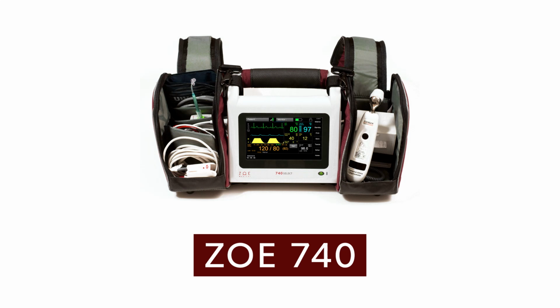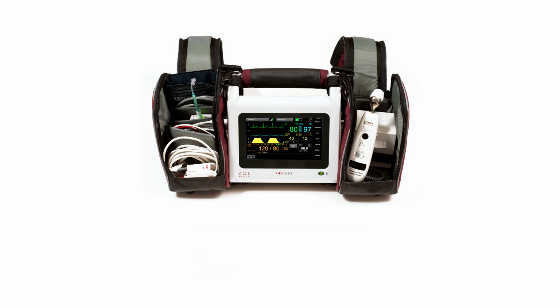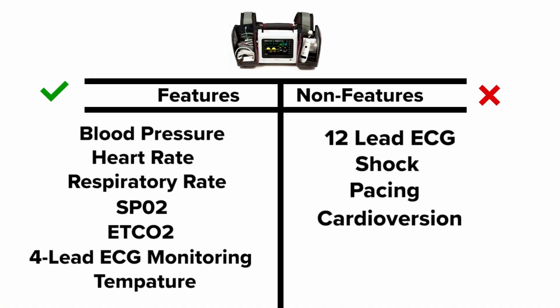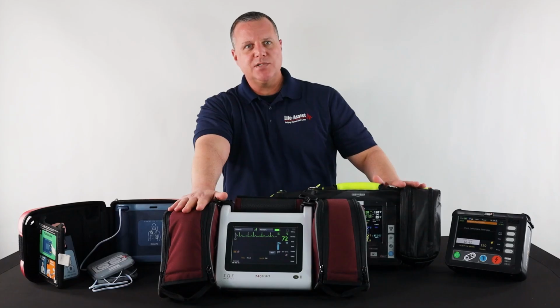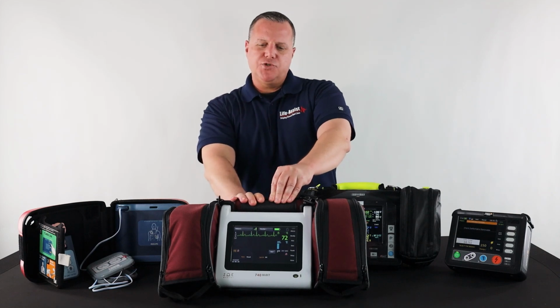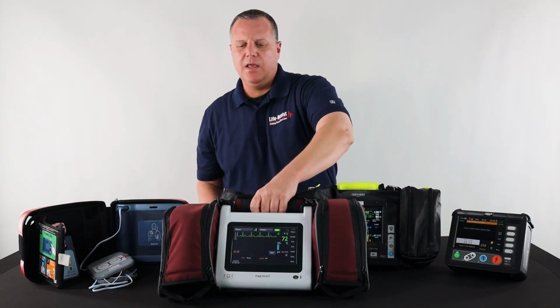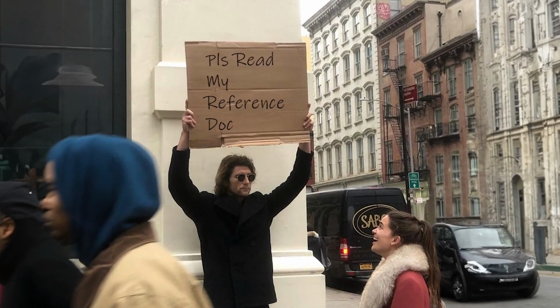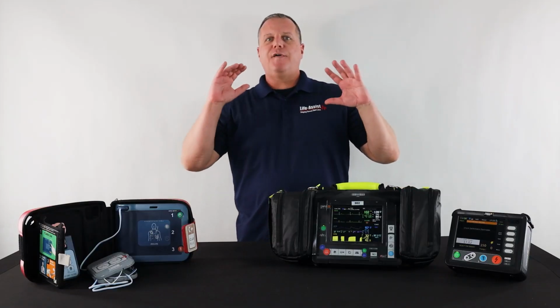This is a great device for an agency that probably uses AEDs, but they want the ability to do electronic patient monitoring and get all those vital signs we talked about, but not have all the extra fancy bells and whistles that the cardiac monitors have, okay? So wanted to introduce you to the Zoe. Again, my reference doc that'll be attached to this video will have a lot of extra information about all of these devices.